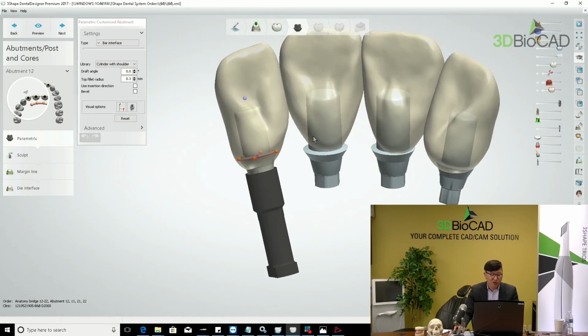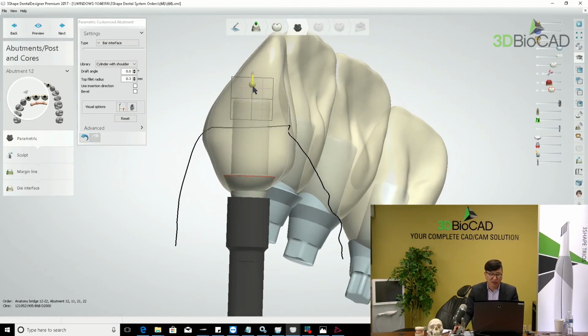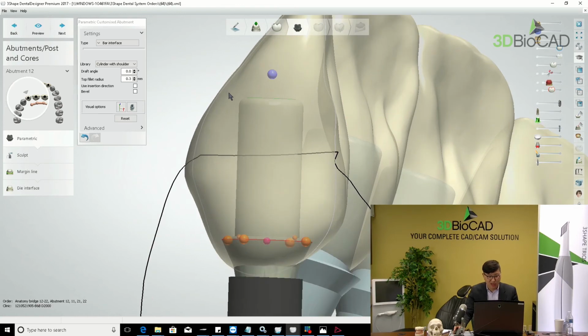I don't want to go too long or too short, so I can find the right length of the abutment. The temporary cylinder we know is already really tall, so anyway we have to cut it. But when I do the design, I just bring it down, and I can see, okay, this much is okay, but maybe the facial side is too close and the titanium color can show up, so I can cut it out, or bring it down a little bit more.